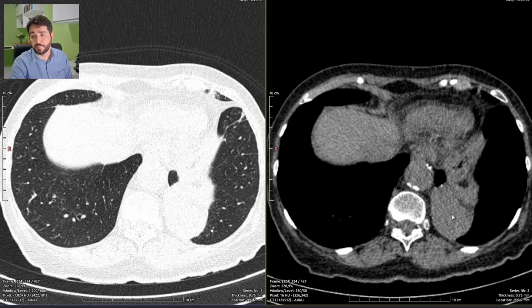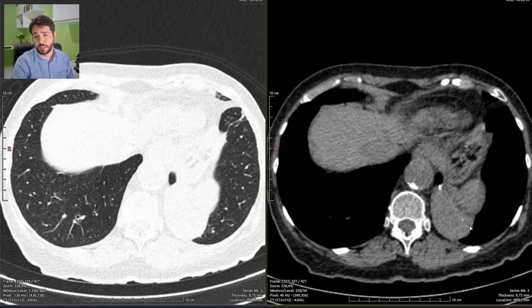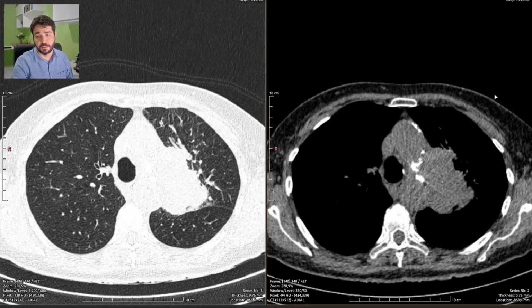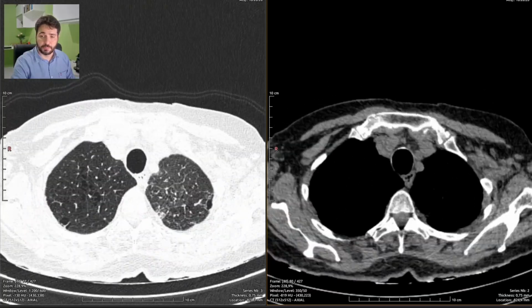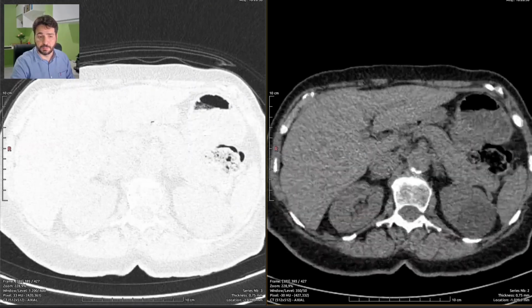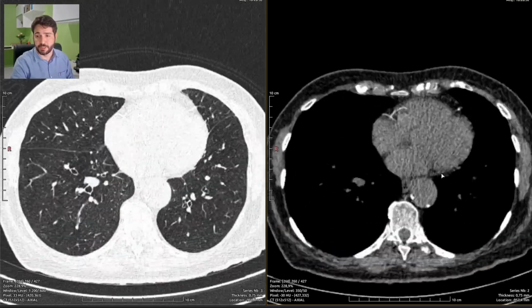And we also have another lesion quite like that one on the basal, posterior and medial segment of the left inferior lobe. So this is the mass right here. It is 54 by 44. It's solid. It has regular circumscribed margins and some peripheral calcifications, but since it's huge, it's an old patient with emphysema that has another quite similar tumor on the upper lobe on the same side, we should consider this one as being another presentation of the same tumor. It's much easier not to make a mistake if you think like that.